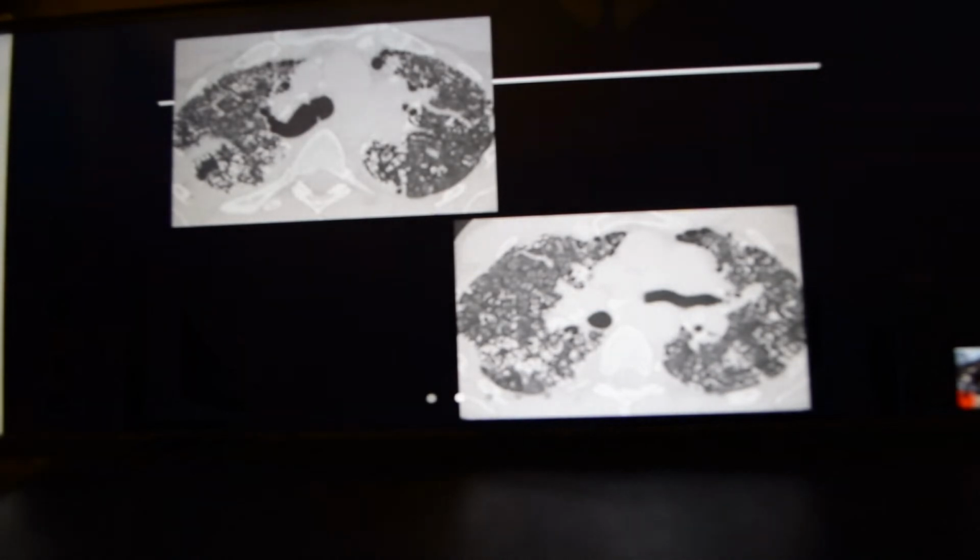Okay, so again nodules. What type of these? Are they subpleural nodules? Anyone? They look to be centrilobular nodules because they are sparing the subpleural region, they are 5 to 10 millimeter, and they are away from the pleural surface. So they are centrilobular nodules, and this is a feature of hypersensitivity pneumonitis, sarcoidosis, Langerhans cell histiocytosis, and cellular bronchiolitis.